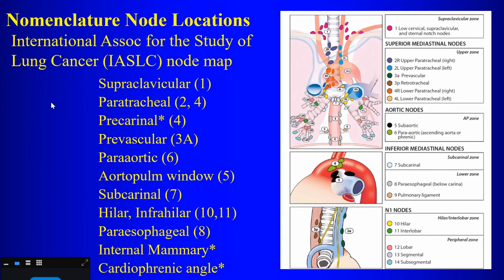Now, I've given you this also when you're reading the CT scans, especially for the oncologist, especially for staging the patient. There are these lymph node stations that are actually numbered. I'm giving you this nice chart with all the lymph node stations. I don't expect you to memorize this. But when you're reading the studies, sometimes the oncologist will want to know which stations are involved. That does determine the staging and what they're going to do. Also, it determines what nodes are accessible by mediastinoscopy for these patients versus transbronchially. So that's also important.